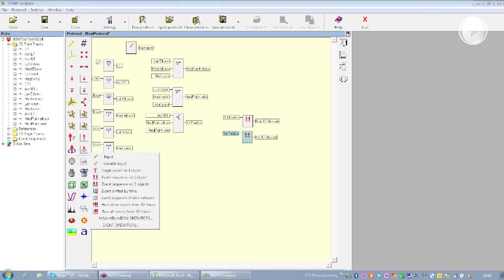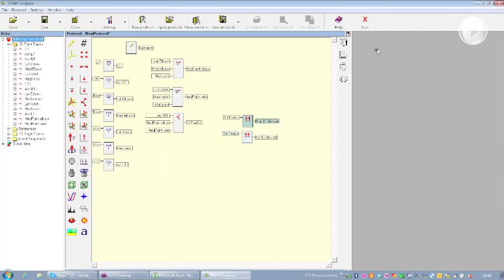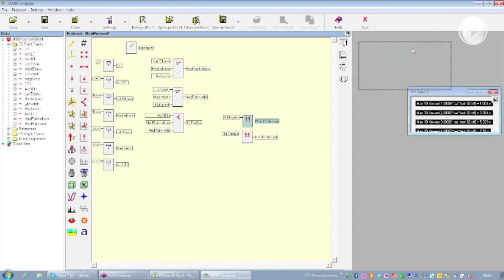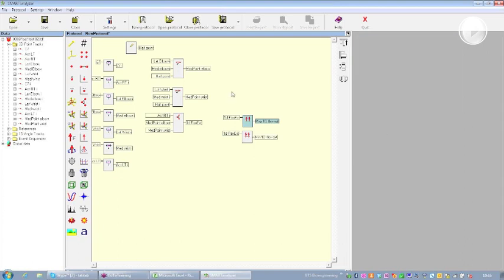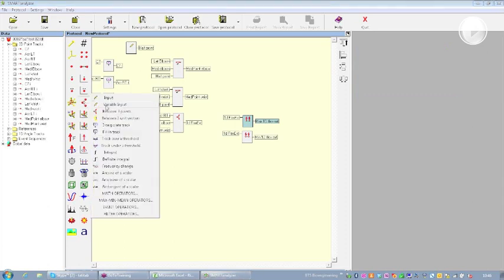No, sorry, I need to know which is the, here we have the timing, of course, sorry, I switched a passage. We have the timing in which I have the maximum. I want to know the value of this maximum angle, so I just need to use another operator, this time on the 1D angle tool, in order to know the value correspondent to the event that we just selected on the track. So a single object of a track defined by an event.